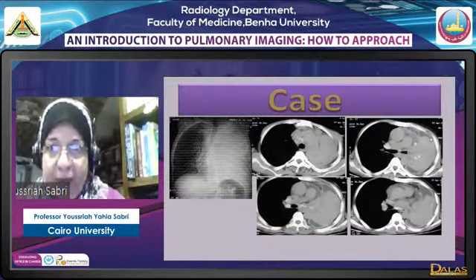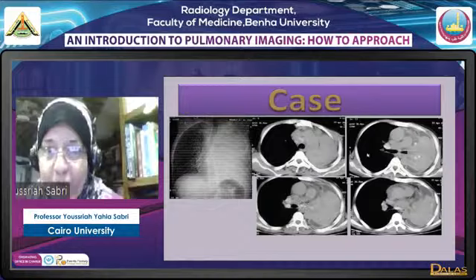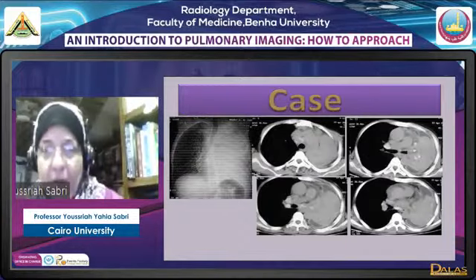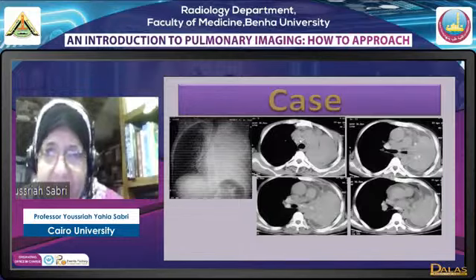This is a resorptive collapse. Effusion is noted. Parietal pleural thickening is seen. And we have multiple lymph nodes with calcification. We have also calcification at the hilum of the lung. What was this? Adenocarcinoma metastasis, okay, to the mediastinum, to the pleura, and endobronchial metastasis in the lung.